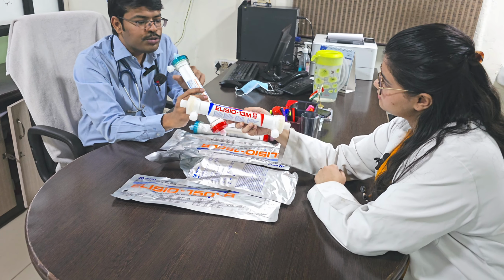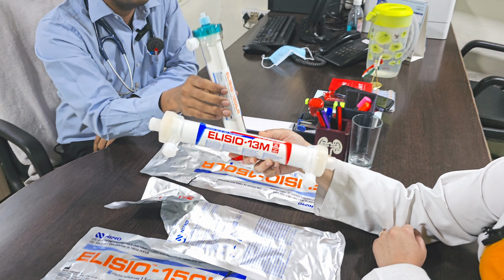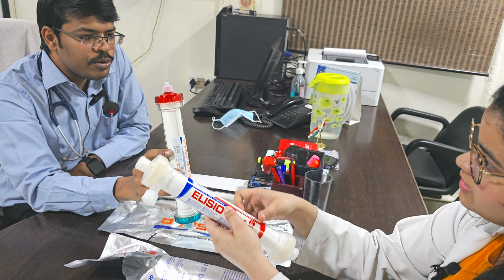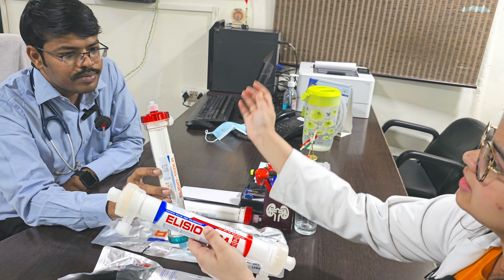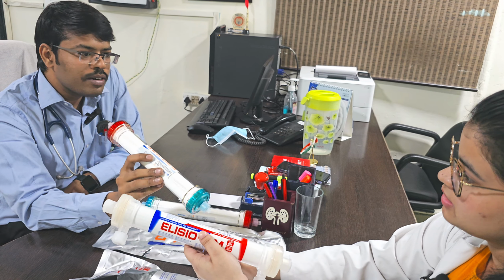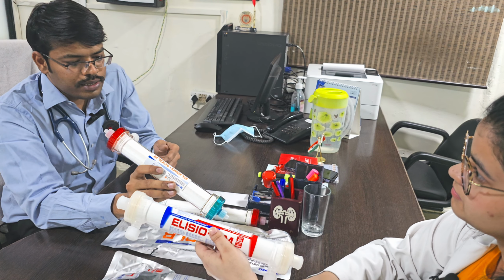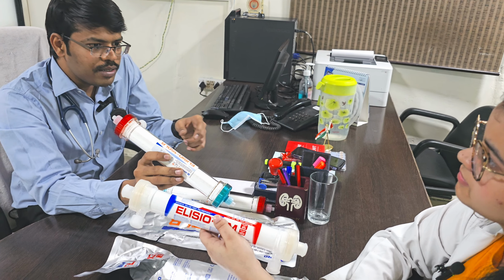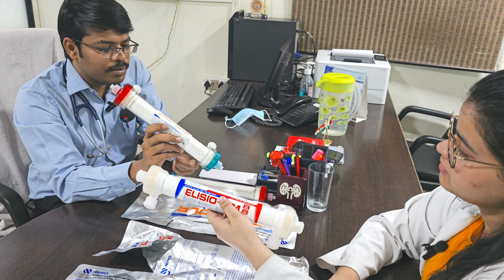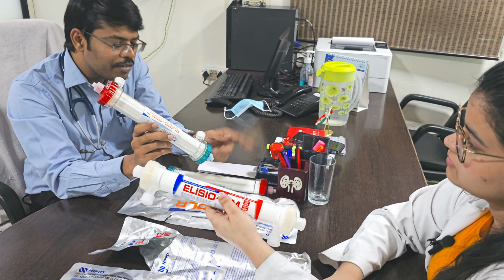Pragati, will you tell what is the use of this color coding which is present in this dialyzer, which is not present in this dialyzer? Yes, sir. Sir, it is to identify the entry port and the exit port for blood for the technician. Since we are going to use it multiple times, the technician who is using it might be different. So to have a universal color coding, red means blood entry, blue means venous side. That means blood is leaving from this side.